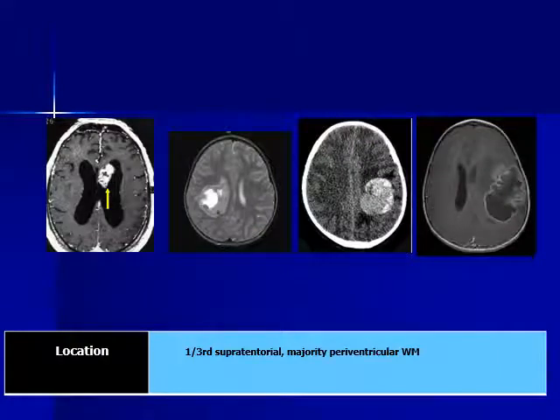As I've told you, it can occur supratentorially. It may be within the lateral ventricles, but in most cases, it likes to infiltrate the surrounding white matter. So don't be astonished if a tumor like this, which you may write as a glioma, has a pathological report saying that it is an ependymoma. Actually, ependymoma is a subtype of glioma, but if it is located intraventricular, it is easy to diagnose, but if it infiltrates the surrounding white matter, you can put a differential diagnosis of ependymoma or a glioma.